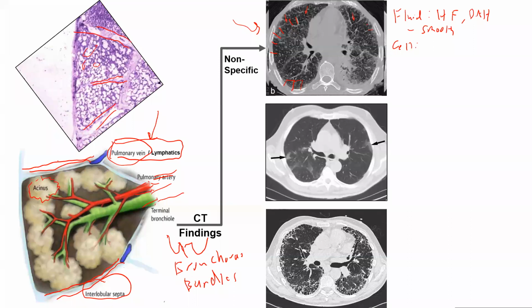So you can actually see this outline, you can see this thickening. So cells, you can get malignancy, you can get sarcoid. Those sarcoid will usually be more nodular because it causes kind of granulomatous thickening of the interlobular septa. And lastly, you can also even see infections, usually like viral or PCP.